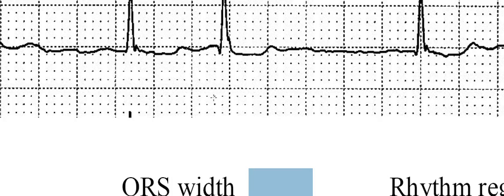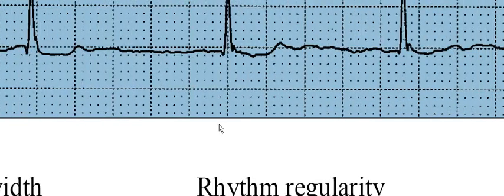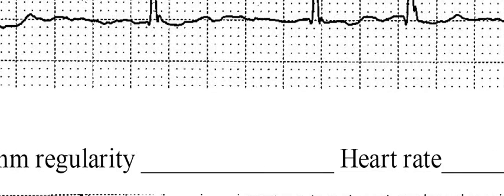And we are going to double check that, make sure that we're not too far off. Here to here. Yeah, that's a 0.06 from the middle of that box to see it ends before here. So you're going sideways, here you're going down, so that puts you in the middle of the big box. So a little 0.06, maybe even a 0.08 for that one. This one ends here, there. Sometimes I'm getting 0.06, sometimes I'm getting 0.08. You could be really technical and write 0.07 if you'd like. I'm going to write 0.06 to 0.08 because I could not decide. It still doesn't matter because as far as normal goes, they're perfectly normal.